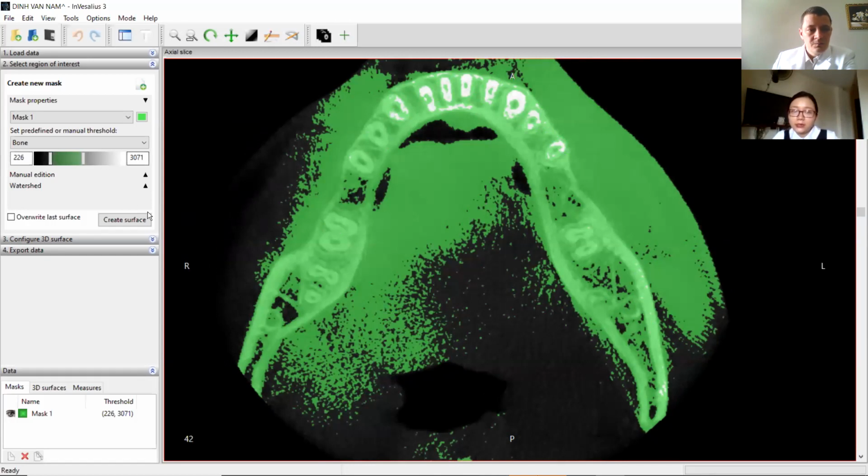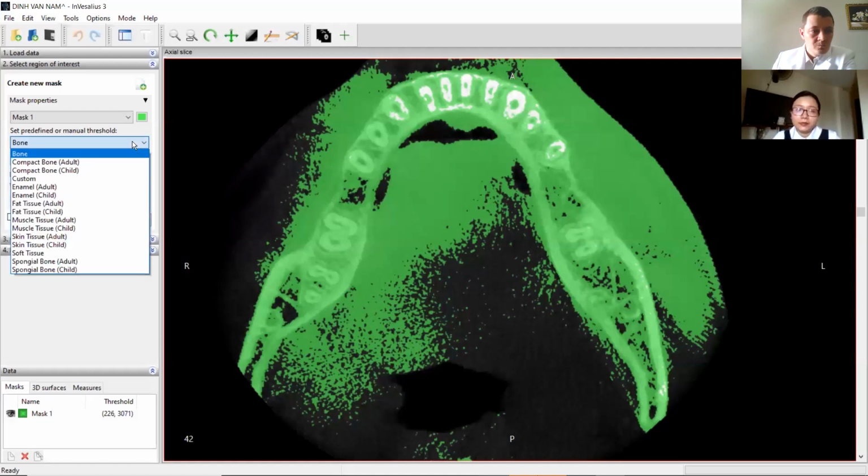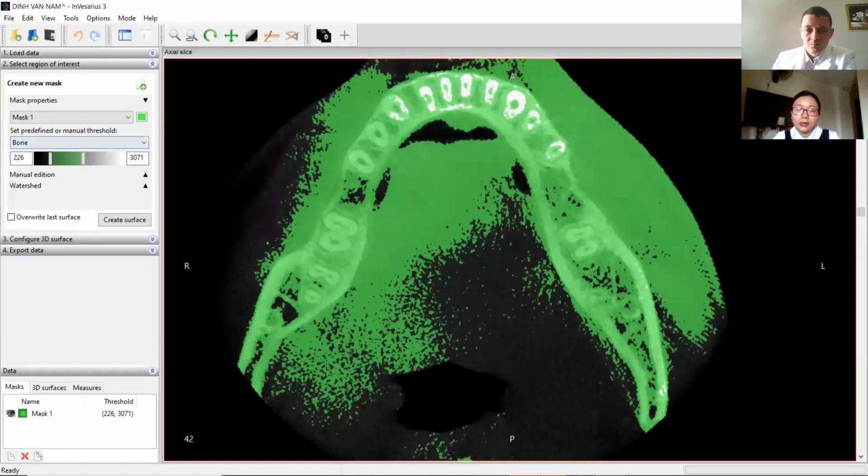Thì ở đây mình sẽ giải thích thêm một cái nữa về việc mình sẽ tạo ra được cái hàm dưới này. Ví dụ như ở ca này bệnh nhân cần cắm implant răng 36 46 thì mình có thể luyện tập trước, đối với những người chưa có kinh nghiệm, là cắm implant trước ở đấy chẳng hạn. Hoặc là có những ca nào răng ngầm mà khó quá thì mình có thể in trước cái mẫu hàm ra để mình có thể luyện tập trước cái phần tiểu phẫu này cho nó cẩn thận. Yes. Okay.